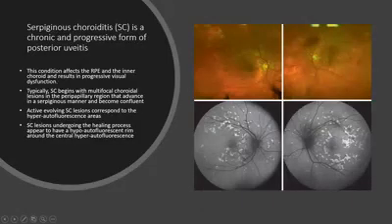When we do the fundus autofluorescence, we can see these hyper-autofluorescent lesions here. These lesions are usually the indication of active lesions. And if you look at this lesion, it is a hyper-autofluorescent lesion with a hypo-autofluorescent rim, a blackish rim. This is the healing lesion.